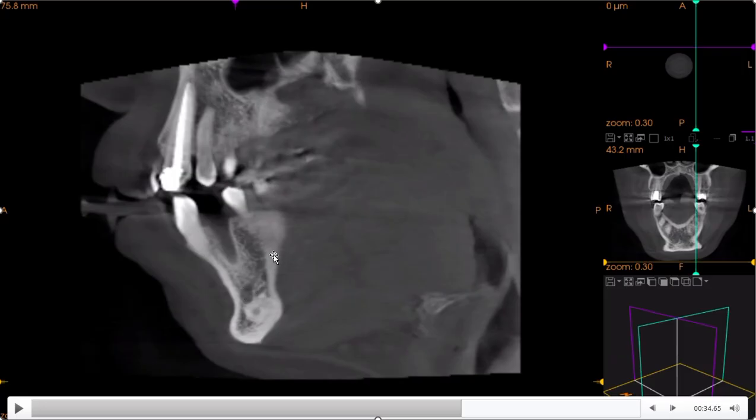Now, there's something called the anterior loop of the mental foramen. So here we need to be away from it with an implant about 5 millimeters. So this wasn't ready for an implant yet because I didn't have enough length to be safe from it. So we wait for the bone to be more, and then we can do an implant easily. So here we can see also the endo treatment. Very good endo, homogeneous, all of those we saw it on the CT scan.